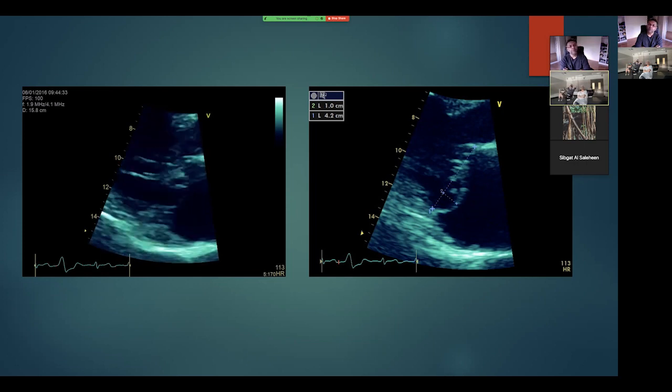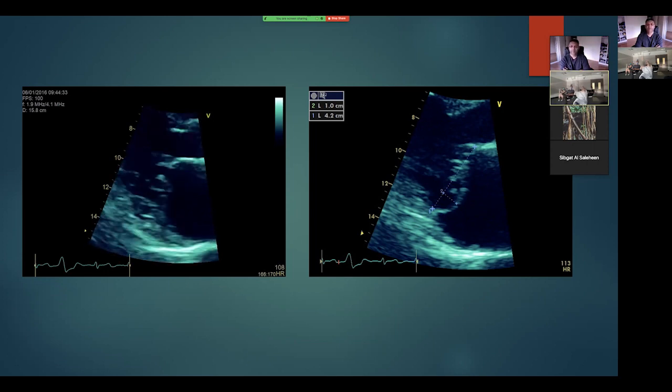Or you can say P1 or P2 or both, because the apical four-chamber was suggestive of P1 as well. But the problem is that when you get a prolapse, sometimes you see the part that's prolapsing, but say P1 might have been normal and we see P2 prolapsing in that view because it moved out of line. Exactly. To be certain, what should be your next step then?